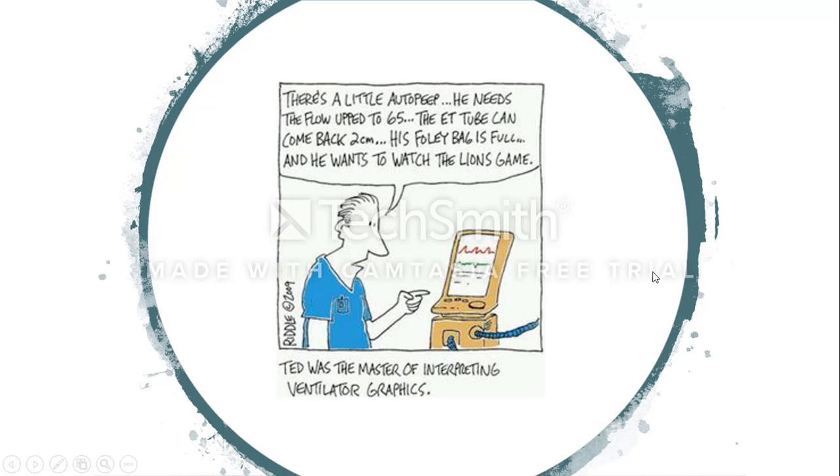There's a lot of information that we can gather at the bedside from these ventilator graphics, but I'm not so sure we can tell if the patient wants to watch the football game or not.